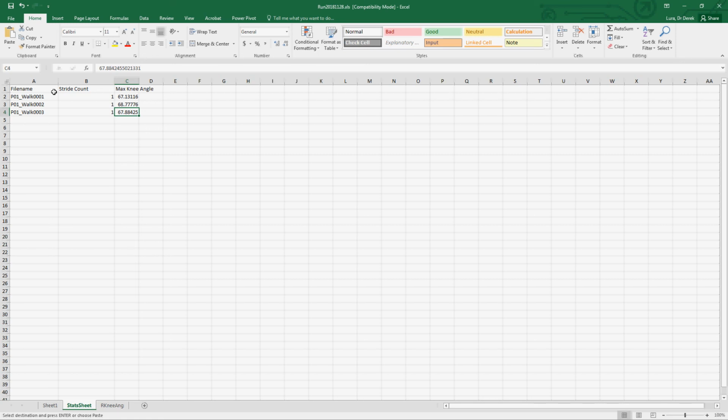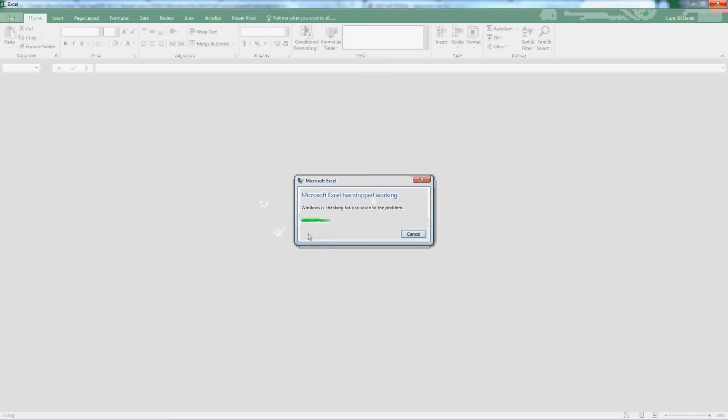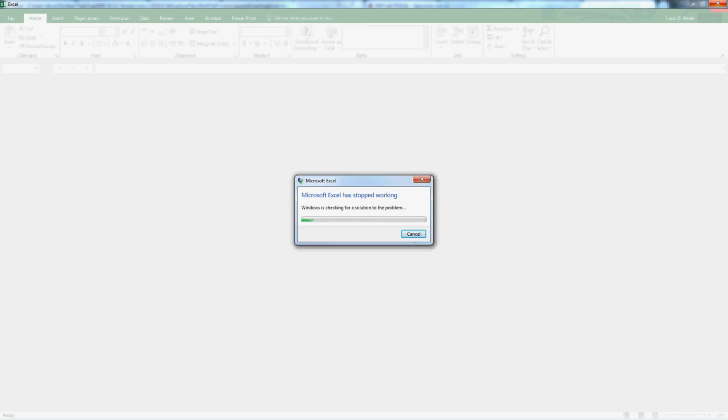And if it didn't work for just one file, I could go back and say, okay, well, I'll fix that one file, manually pull out whatever the maximum knee angle is for that stride, or fix the heel strike times for just that one file. Say I got a miscount or there was an extra minimum somewhere that threw off my calculation, and then I don't have to do it manually for everyone, just the ones that it didn't work, right? Or maybe I have to change the conditions a little bit so that it runs for a running trial or for whatever else I have.